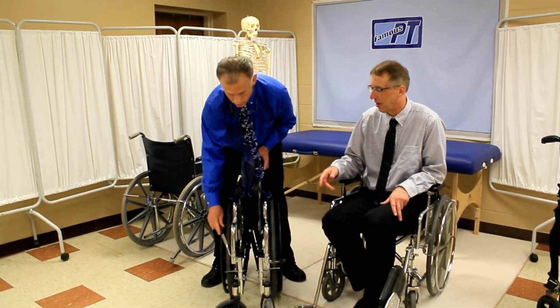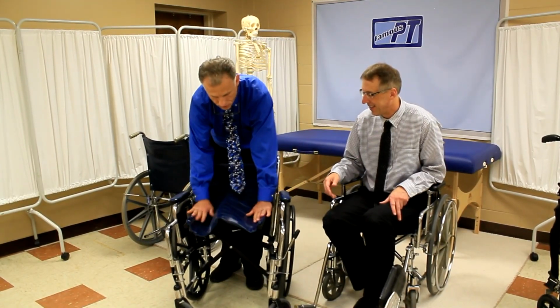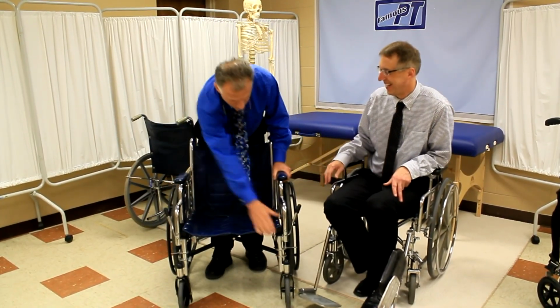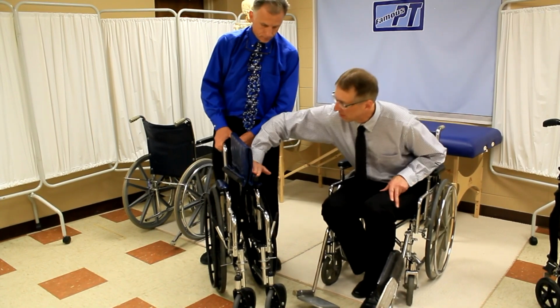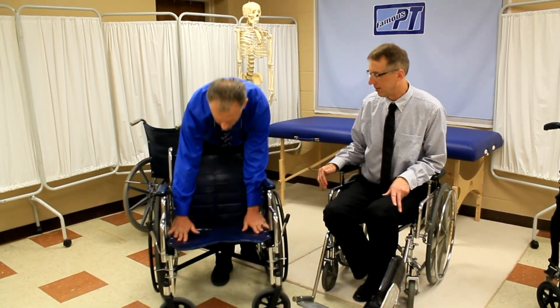Show people how they normally do it, Brad, when they don't know how to do it. Yeah, and then they kind of, here, let me get it down. You just push on the outside and get it back down and it'll pop right in, but people will be coming in here and trying to push it in, and it's a back breaker and you get your fingers pinched in there. So this is really the way to do it. And really, with one hand, you can almost push it down too, can't you? Because once you get it open. Yeah, well, I usually get one on each side.